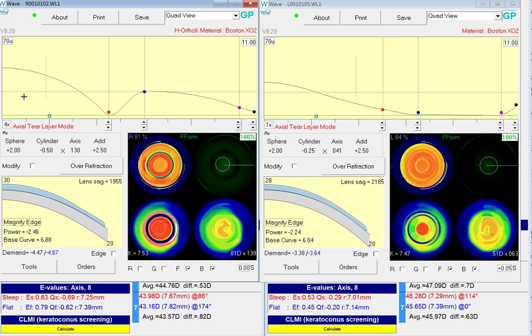a little bit more central clearance, pretty wide treatment zone, but that should fill the patient's pupil very well and provide a little bit more plus power to the retina. I think you can make similar changes to the left eye along the way based on the patient's refraction and feedback. We may need to make some of the zones a little bit smaller or increase or decrease our topo demand, but I think this would be a good next step for this patient to getting slightly better vision. So hopefully that's helpful. Best of luck with your patient.